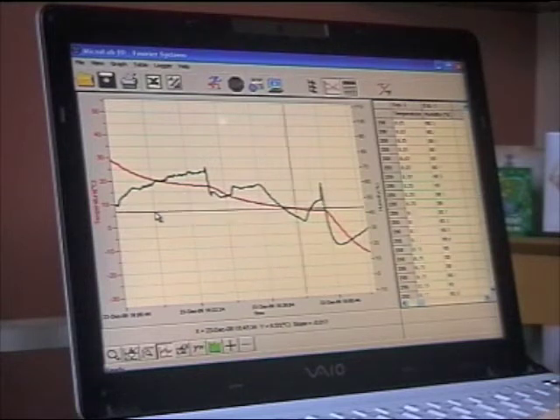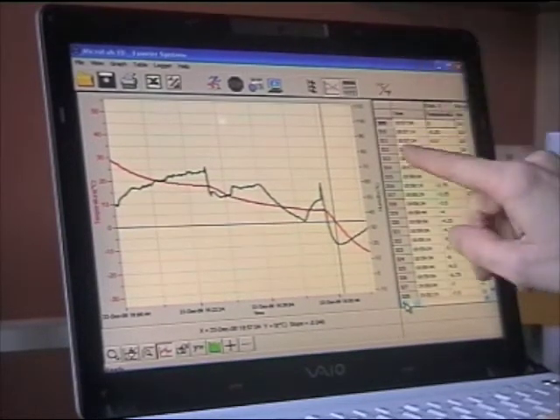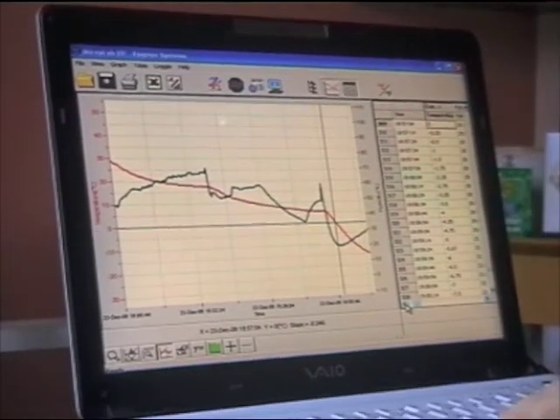So moving down to 0, we can see it's quite late in the experiment, somewhere around 7 o'clock. And here we are, 0. Let me scroll this table so we can see the previous column. It's at 18:57 and 4 seconds.